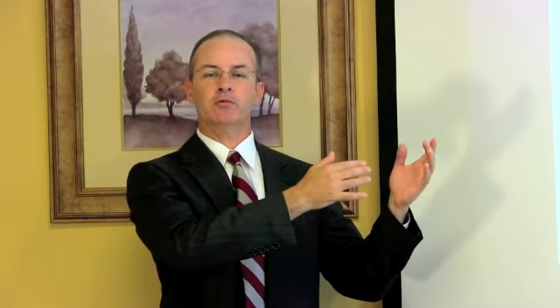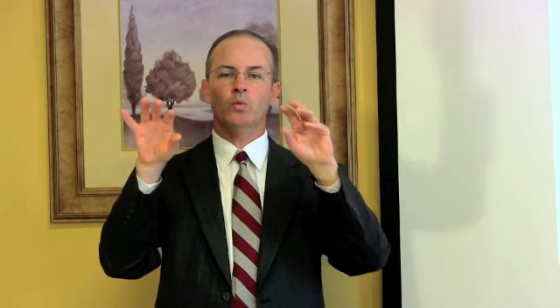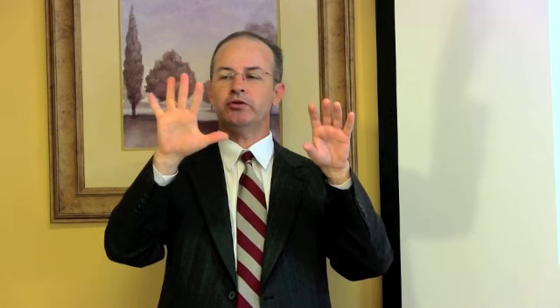We took the patient's brain MRI data at time 1, created the NeuroQuant 3D reconstructed regions, including ventricles. And then we, and I say we, which was Michael Havranek, our medical illustrator, and we worked with him, but he did the lion's share of this work. He took the data at time 2, which was about 2.5 years later, and also did the reconstruction in 3 dimensions of the brain data, including ventricles. We then did a morph movie technique where you take image 1, compare it to image 2, and you interpolate in between so that you can see it shrinking and turning into image 2. So that's how we did it.